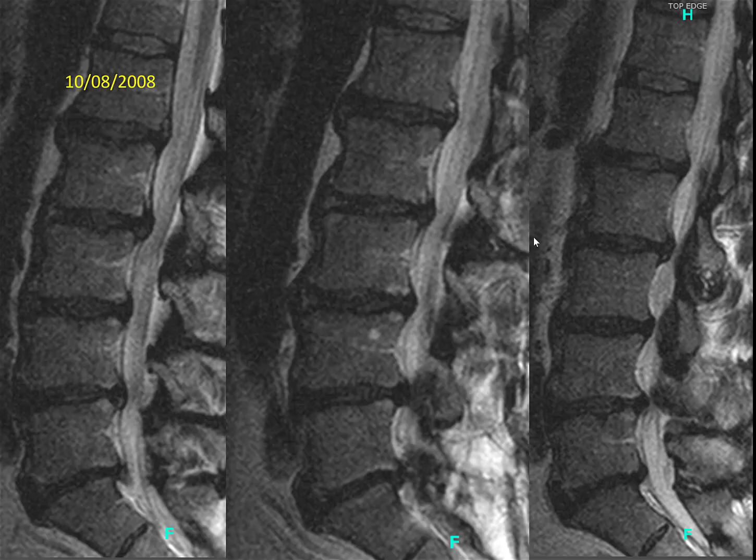So these are the MRIs, and is that a sign of disc disease when they have a vacuum? Yeah. When you're anteriorly in the front of the spine, and you remove the anterior longitudinal ligament with a rongeur, there's like nothing there. There's like a gap. So what happens, I think, in vivo is when they extend, they create a vacuum. So here are the sagittal cuts. You can see decreased signal, bulging, right, at almost every single level. You want to add any questions?